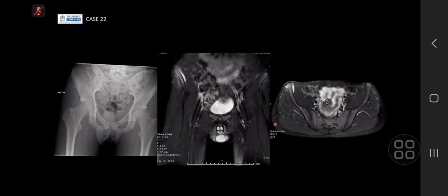Yes. So it's an avulsion fracture. Yeah, that's right. So an avulsion fracture, you can see, is in an older child. The growth plates are almost fused. And the main thing to note is that in kids, you need to know all your sites of potential avulsion fracture.